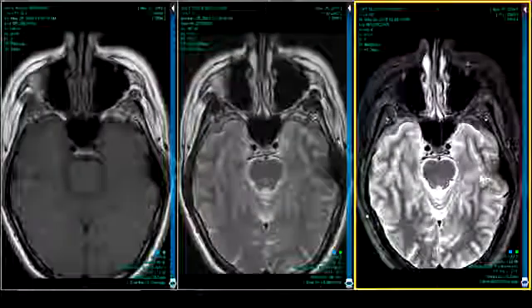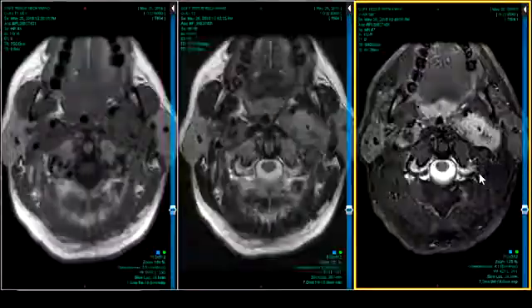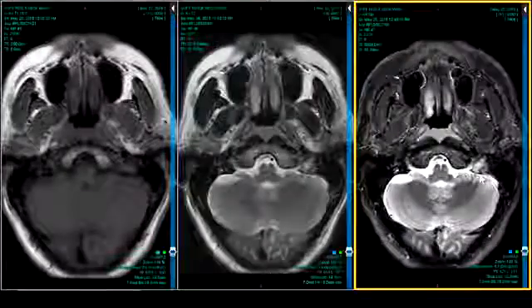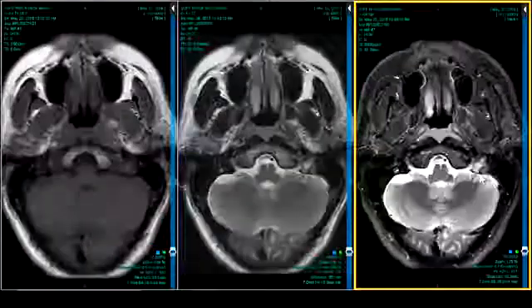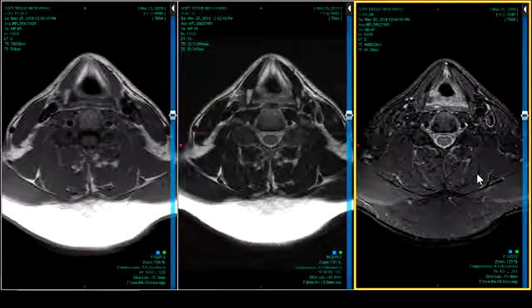And although the flow looks pretty good on this one, surprisingly, because it's a pretty big lesion down low and up high, you're probably going to end up occluding the vein as part of this approach. Most of those nerves, 9, 10, and 11, travel together like triplets. So you get these jugular vein syndromes, Vernet syndrome, Villaret syndrome. You can Google those at your leisure. We'll have them on MRI Online.